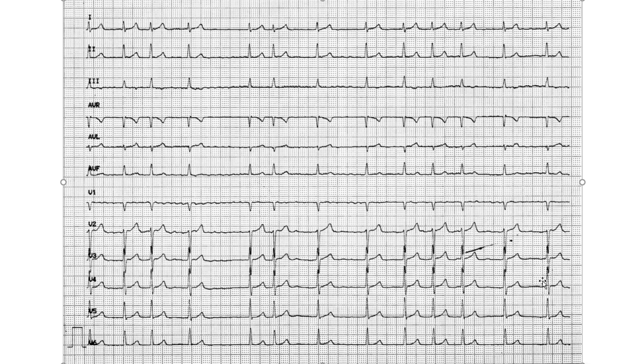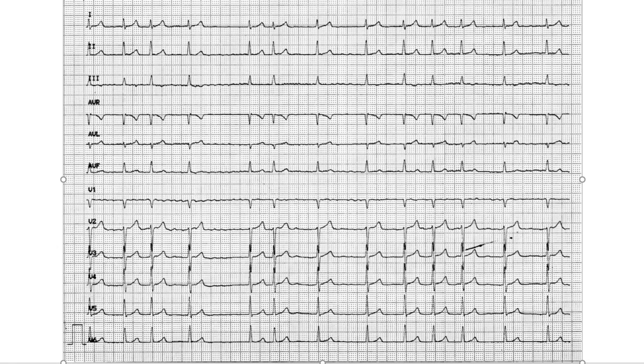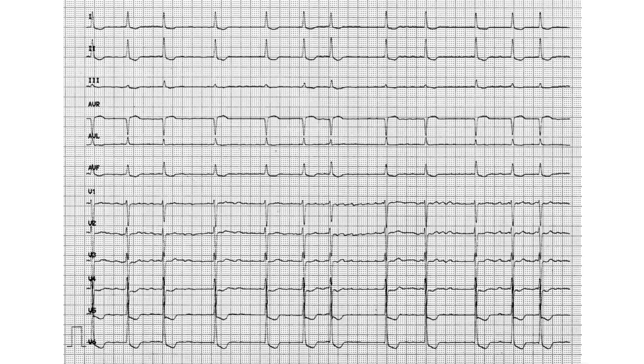You have to go through the next of the 5 points. You check the QRS, Sokolov, Q wave, largest Q, and so on. I'm just tackling this because this is the main point of interest for the time being. Okay, so this is question 22.